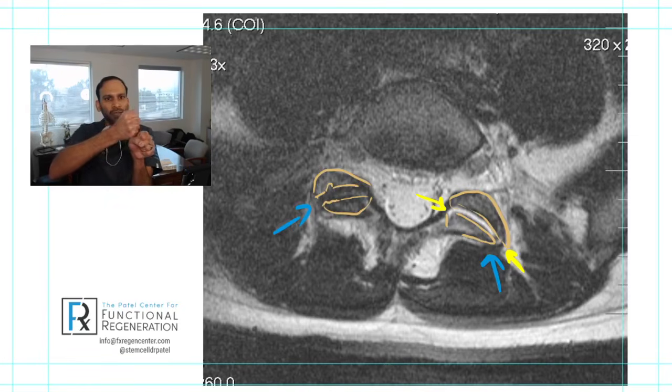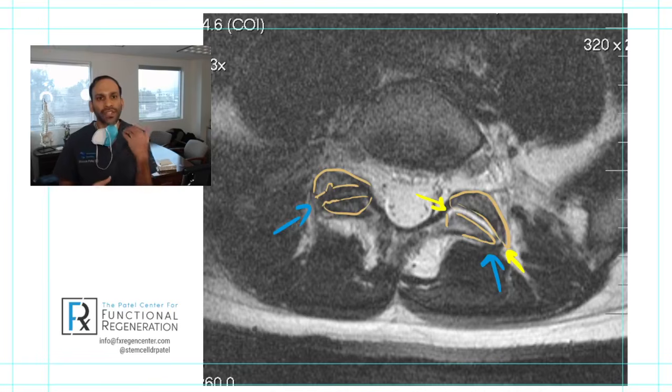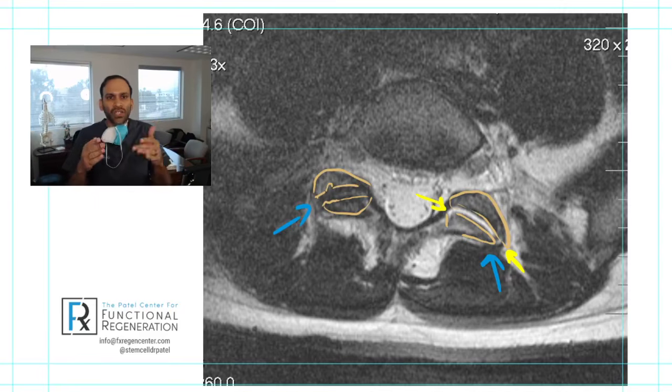Spondylolisthesis is when one segment shifts forward or backwards in comparison to the other. There are several different types, one of which is degenerative spondylolisthesis, when the facet joints start to rub and get arthritis, and that facet tropism occurs, or the orientation of those facets starts to change. That allows for more motion to take place, and that could actually be an underlying reason behind spondylolisthesis.